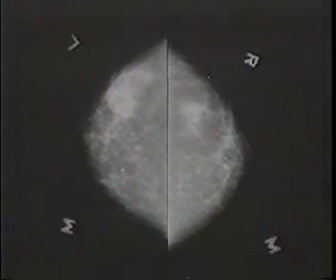This is a woman who has more density in the upper outer quadrant of her left breast than she does on her right breast. You can see that this margin is concave, this one's kind of straight, but this is concave. You can see that there are normal structures intimately associated with part of its margins, but it's not pushing on those structures. It's not disrupting the course of those structures at all.